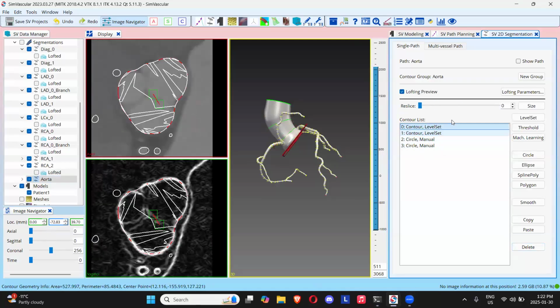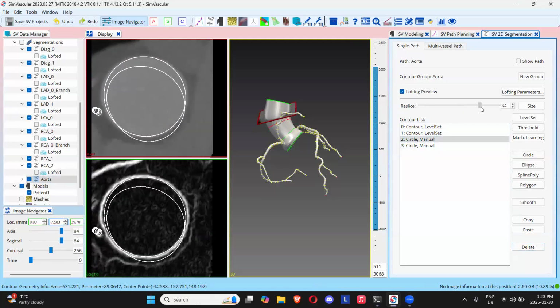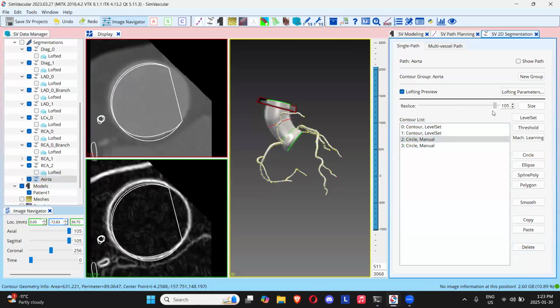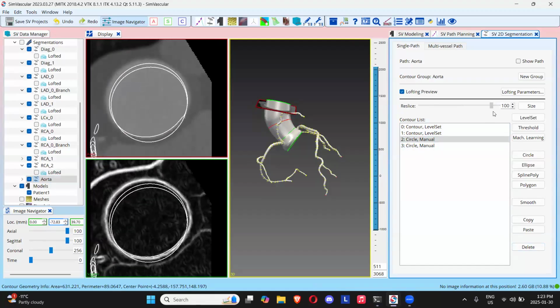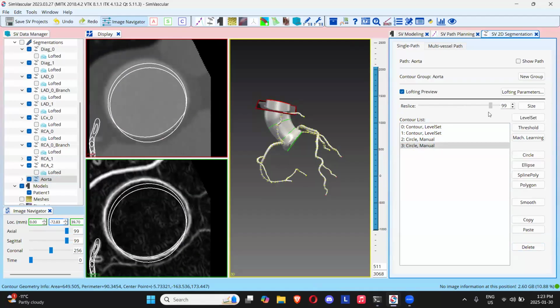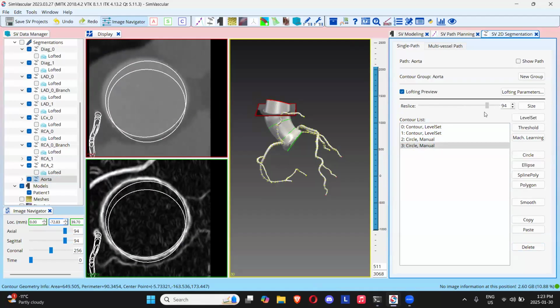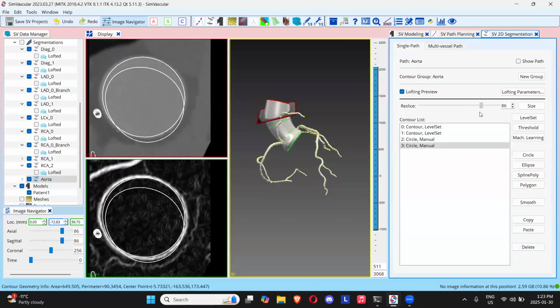Close to it, yeah, if you scroll up. Yeah, if you create a new one. No, go up, go up. Oh, yeah, I don't know why it's twisting that way. The image kind of cuts off. Yeah, that's okay, but if you come down, it shouldn't. Maybe you need to smooth the path. Did you smooth it? Yeah, he did smooth it. You did it? Oh, okay. Sorry. But that's okay. It's all right.